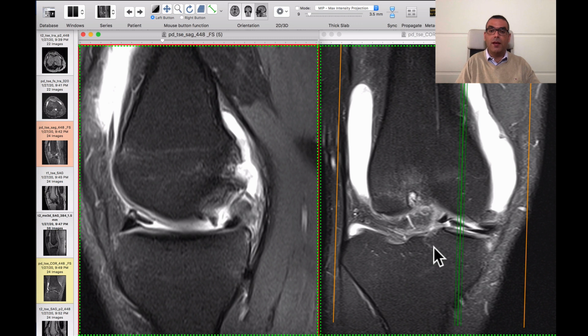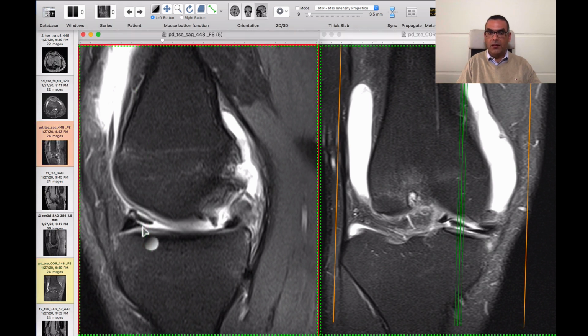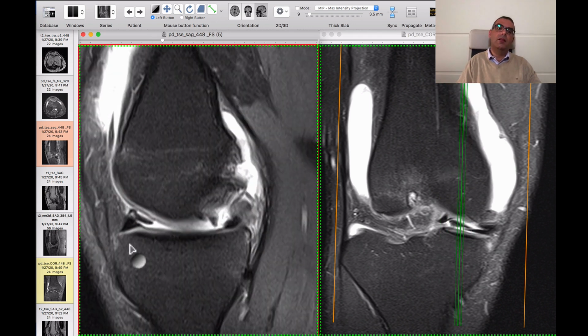As we said, a horizontal flap tear, you will see part of the meniscal girth amputated, and this amputated part will be displaced either to the center of the joint or to the outer aspect of the joint. So now we can see at the anterior horn of the medial meniscus there is a horizontal flap tear with the centrally displaced meniscal fragment, and you can see the site of the amputation and the displaced meniscal fragment lying just above the residual aspect of the anterior horn. So this is called the double meniscus sign, and when you see this, this is pathognomonic for a horizontal flap tear.